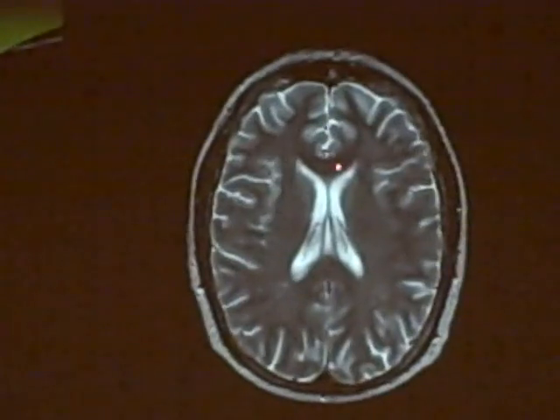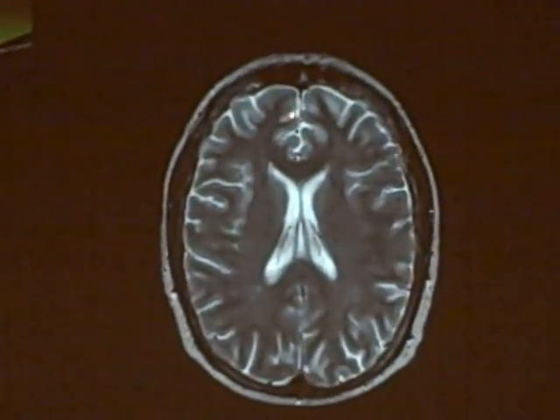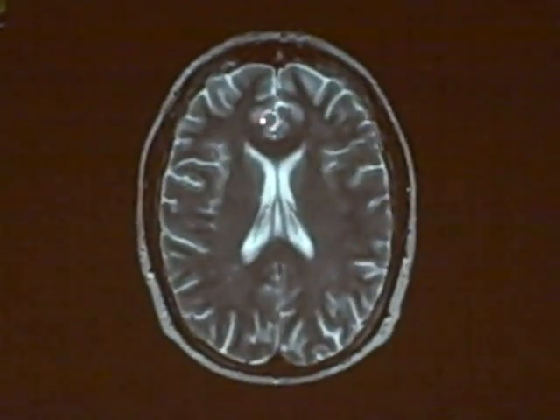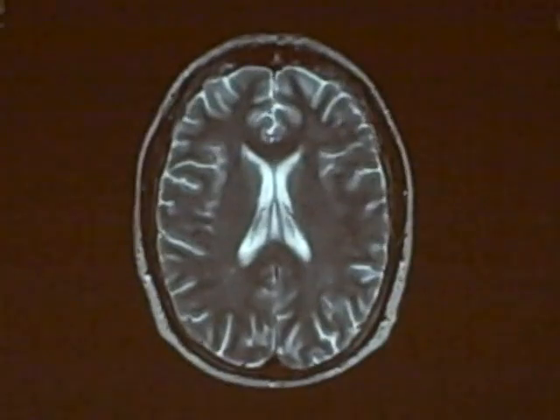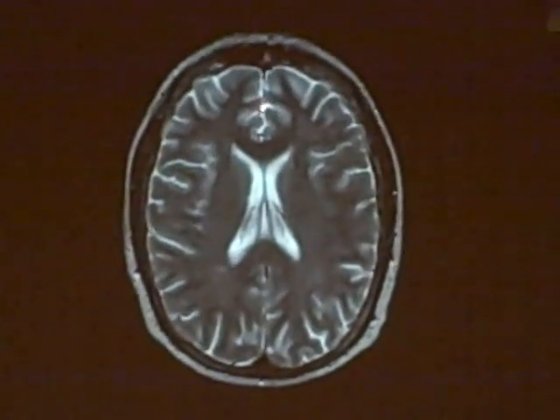All right, so a blood vessel here along the midline, we see a dark area here, here, here, here. This has to be the anterior cerebral artery. The midline blood vessel looping up along the midline. Remember, going back to supply the paracentral lobule, among other things. So this is the anterior cerebral artery.